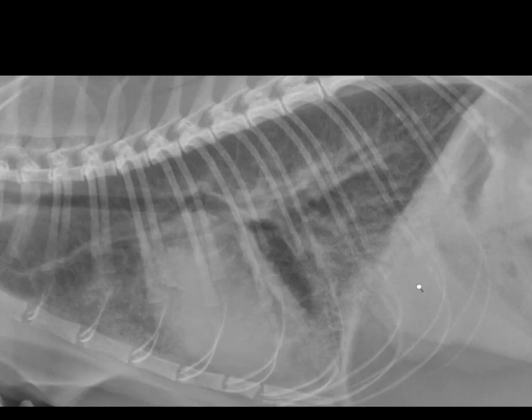Let's go to the lateral view and compare an area where we do and an area where we don't see the pulmonary blood vessels. For example, this part of the lung here has increased opacity, and when I look carefully, I don't see specific vascular margins. Compare that to the cranial lung field, where if I trace, I can see pulmonary blood vessels going towards the periphery of the lung. I would still consider this lung field abnormal because the vessels are less distinct than they should be. So overall, I would conclude that this cat has an enlarged heart, and an alveolar to interstitial lung pattern.